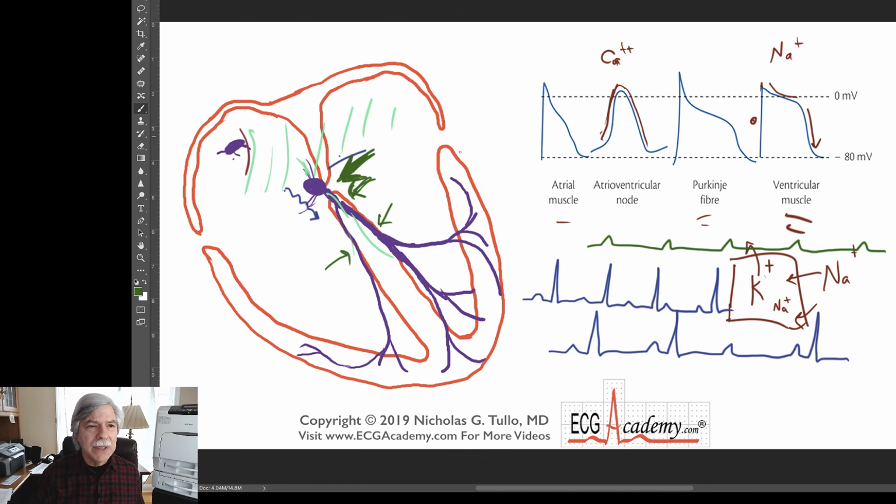So anyway, let me show you some interesting cardiograms. So with this patient, this is a case presentation, right? We're 21 minutes into this. Wow, that's cool.